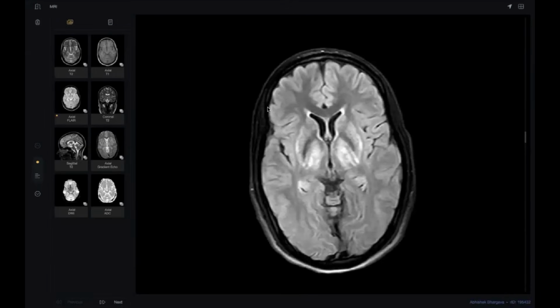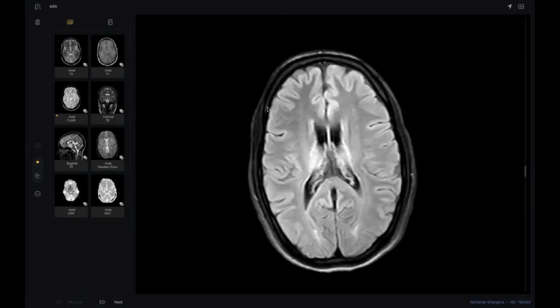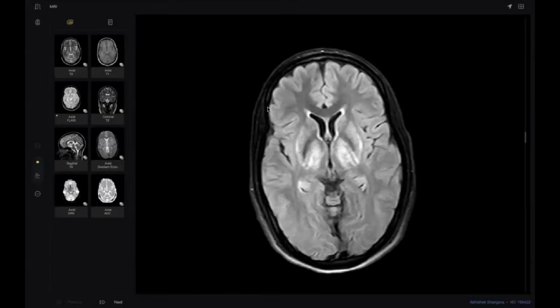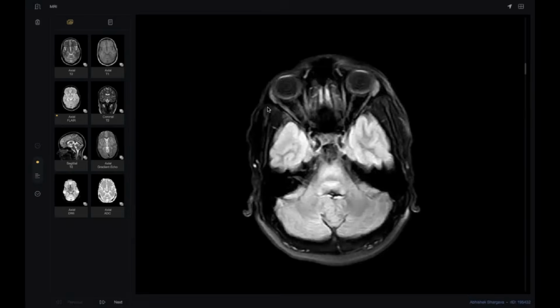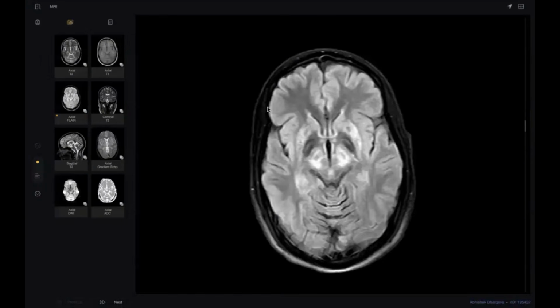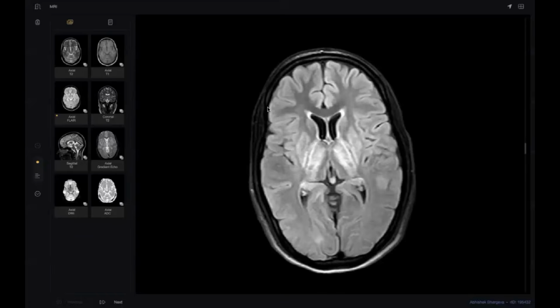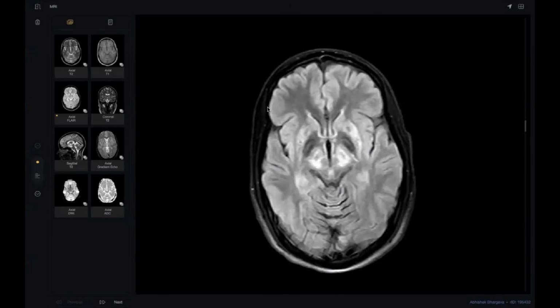Is it better to describe the abnormality here as a signal abnormality or a lesion? I see a signal abnormality. It appears as a systemic condition. Because if you say lesion, you give an impression to the examiner of a local, focal lesion. Yes. Okay, go on.